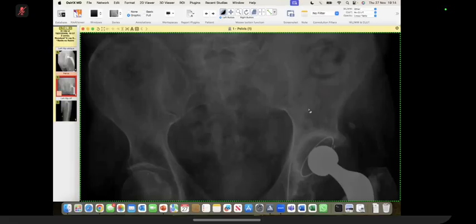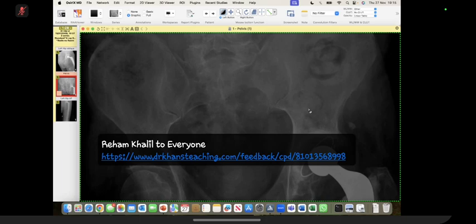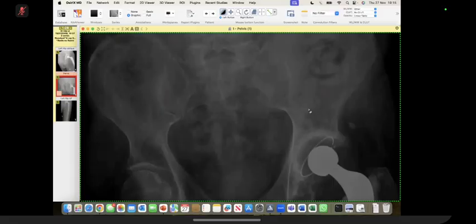There is suspicion of subtle, tiny calcification, but I cannot see any definite osteoid matrix in this film. Other than that, sir, I cannot see any periosteal reaction in the adjacent bones. The lesion also has a wide zone of transition. So keeping in view these findings, this is likely an aggressive lesion involving the left half of the sacrum and probably involving the sacral foramen as well.